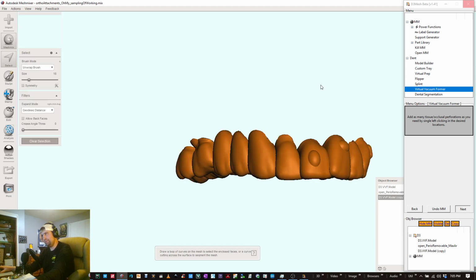What do we do? 0.7. 0.7 millimeter thickness. 0 millimeter impression gap.